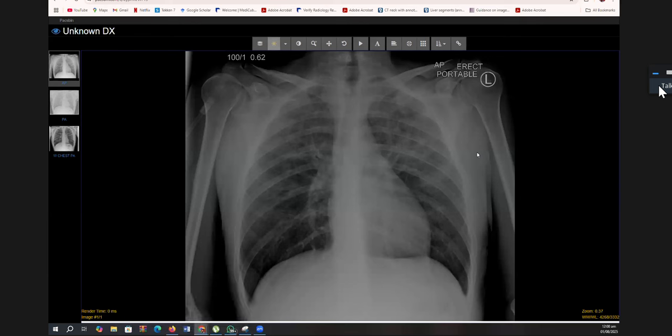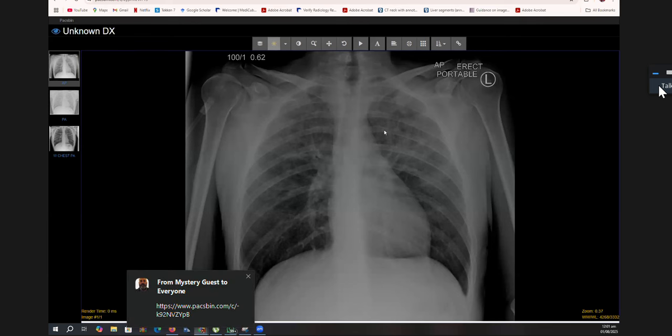Yes. And I'll show you the HRCT that was done. I don't think this man needed an HRCT really. He just needed a bronchoalveolar lavage with PCR of the lavage to make the diagnosis. But this was the CT, which shows very nicely the distribution of the consolidation and ground glass change. Yes, sir, perihilar ground glass changes.